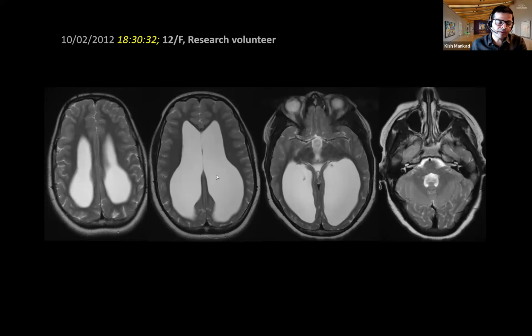So this would have been a ventriculomegaly, which would be antenatal in this child's life, except that it did not bother her, luckily, and she never came back for any further workup or anything. If you allow the surgeons near such patients, they want to make things look better. And if you put a drain in there, you will pick up zero or even negative pressure within these ventricles.